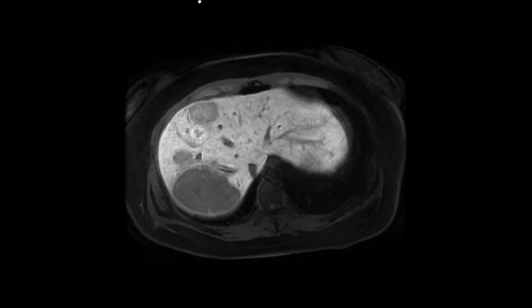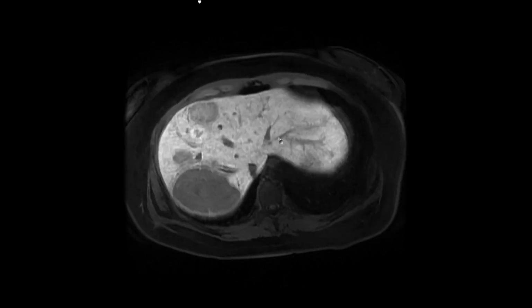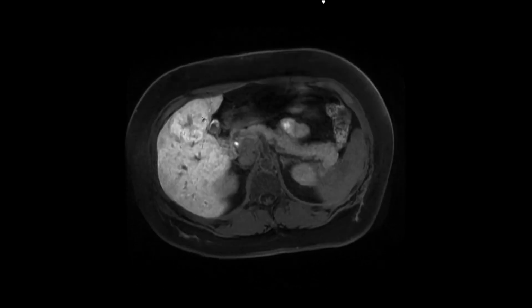So this is a young female patient, and again, the purpose of this is not to show you how to characterize liver lesions. We'll talk about that later, but the purpose is to know what a normal MRI looks like and then show you how things stand out nicely compared to background on these various sequences. But these lesions here are predominantly mostly adenomas, especially this large one posteriorly. This lesion here, more inferiorly, is more confidently an FNH, or focal nodular hyperplasia.